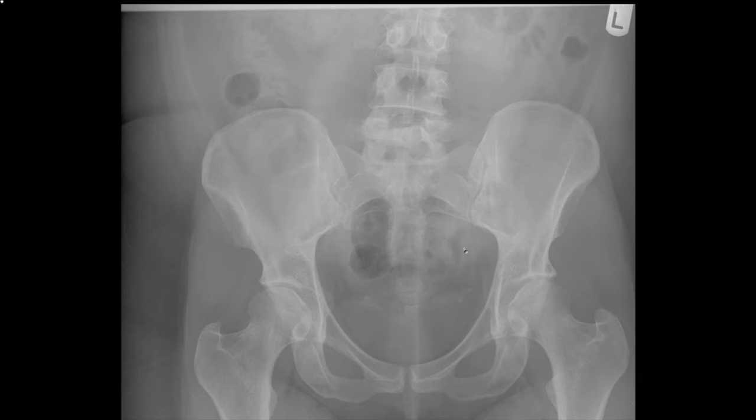So in the pelvis we have one big bony ring. So if you have a fracture through one part of the bony ring, there is nearly always another fracture somewhere. The other fracture may be separation of the sacroiliac joint. Similarly, there is a ring formed by the pubic rami inferior to the acetabulum here. So if you get a fracture of one pubic ramus, look for a second fracture of the other pubic ramus.